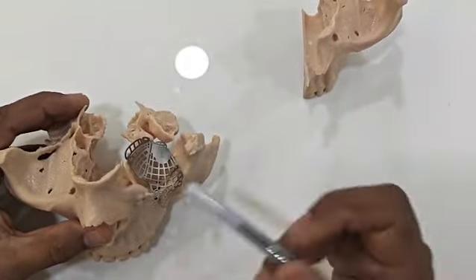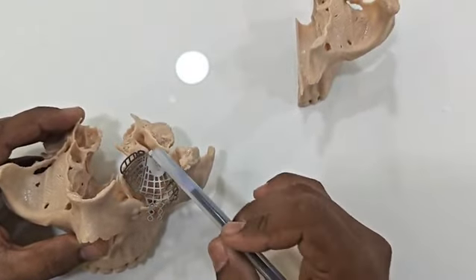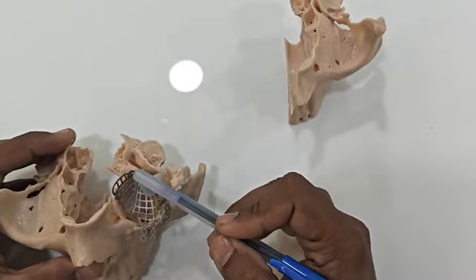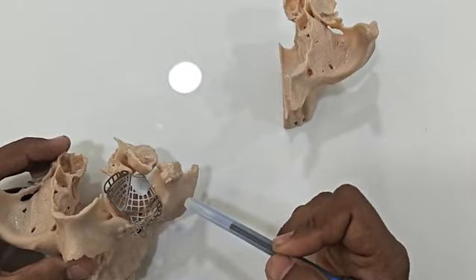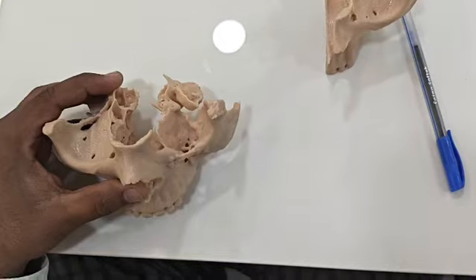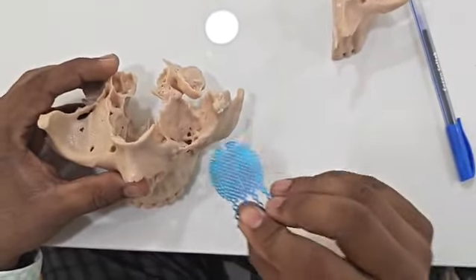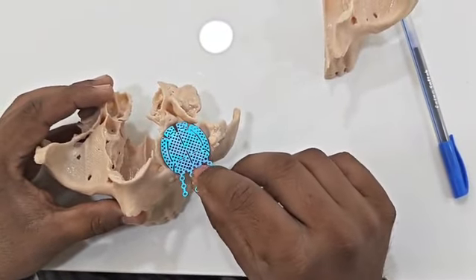We just have to cut it off medially because we don't want this much extension reaching up to this area medially; that's practically impossible. So we will cut this plate off medially, and this extension of the screws we will just bend at the infraorbital rim region and fix it. The second option we have is the Orthomax plate, which is a medium sized titanium plate, which is also giving a good coverage of the floor of the orbital defect.